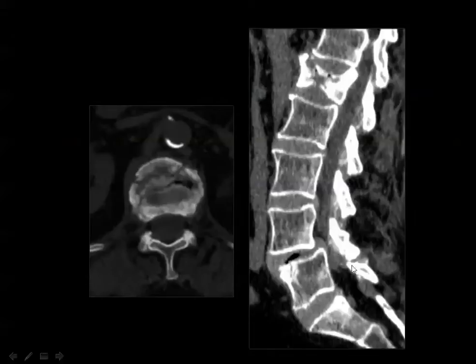And in this type of fracture, you can see compression fracture of this is L5, L4, L3, L2, and this is L1 vertebral body with depression of the superior and inferior end plates. There is mild posterior subluxation of the vertebral body encroaching on the spinal canal. The axial image shows comminution of the vertebral body with no evidence of bone fragments inside the spinal canal. Also in this patient you can see a first degree spondylolisthesis of L4 over L5 with vacuum phenomena in the intervertebral disc space.